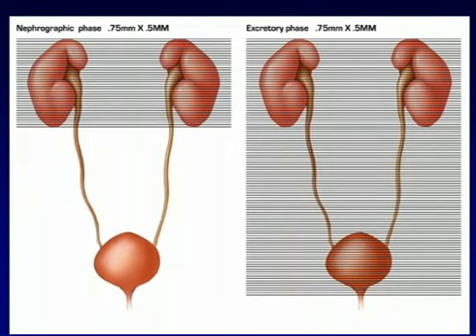Since we are thinking about displaying information as a volume, it really defines your protocols. So from non-contrast CT, the sections are thicker, typically 3 millimeters. But when we go to the other phases, we'll do the thin sections, typically 0.75 millimeters by 0.5 on a 16 or 64 slice. On the cortical medullary phase, we'll only scan the kidney. We used to scan through the pelvis, but really the additional information typically was minimal, and we want to minimize the dose to the patient. And then nephrographic phase, if we do get it, we'll again do the thin sections. And excretory phase will be the phase that we cover the entire pelvis and bladder, ureter, and the like.